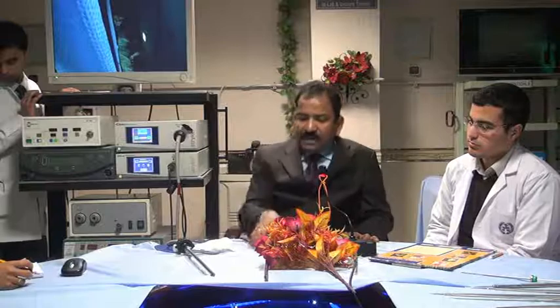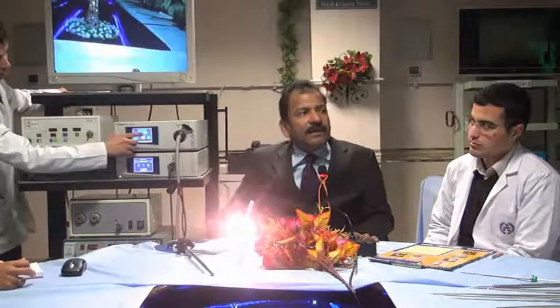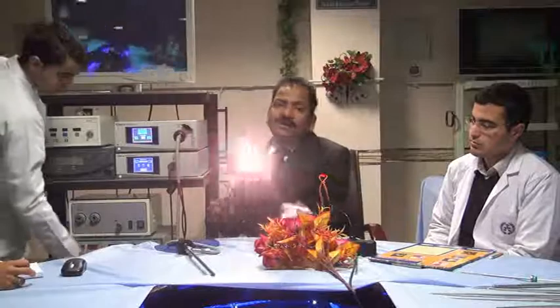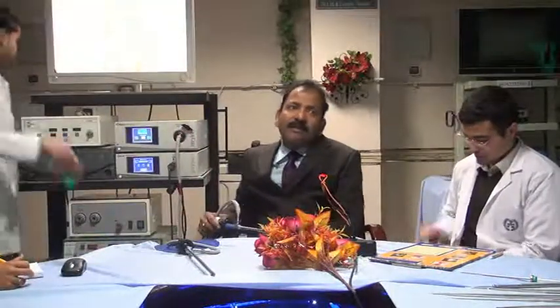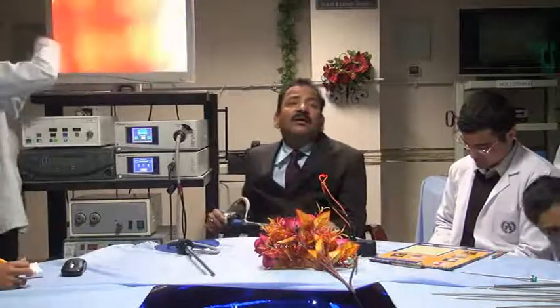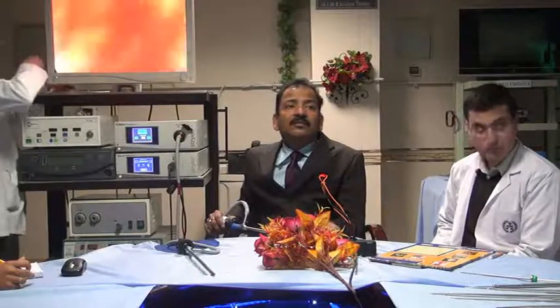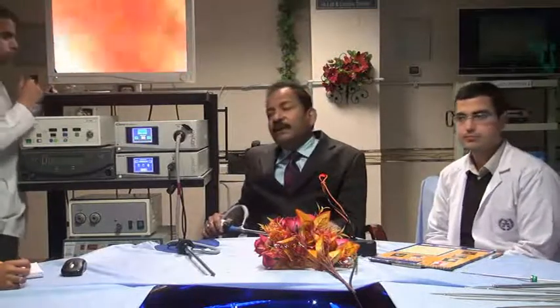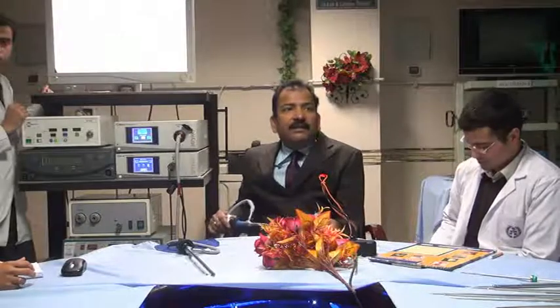Now, as soon as your camera is in your hand, the first thing you have to do is focusing, followed by white balance. Now, what is white balance? When we are doing white balancing, all the three colors, red, green and blue, have equal intensity. What he is saying is that when we press the white balance, all the three colors come at the same level. It comes in the middle.